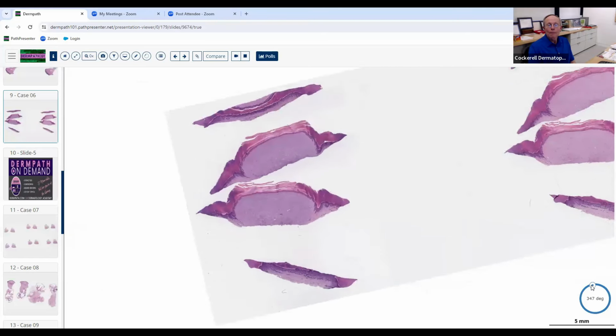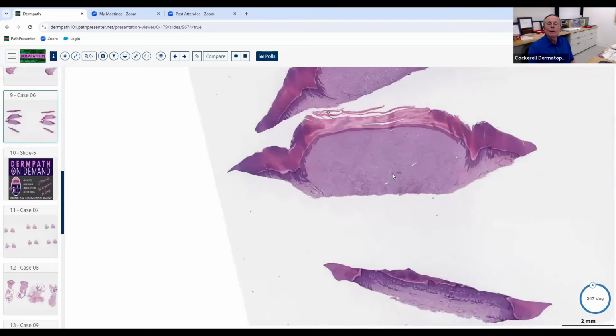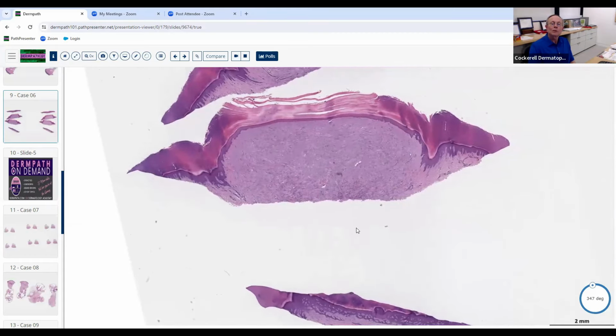Okay. A shave biopsy once again, and look at low magnification. We say, well, this looks like some type of a neoplasm here. It's not inflammatory. And certainly, just like the last one, if we apply our criteria, it looks very benign, very well circumscribed. If you ever see this ball and claw type of morphology, like we're looking at right here, that means two things.